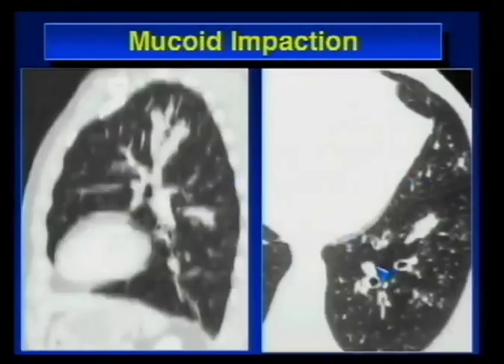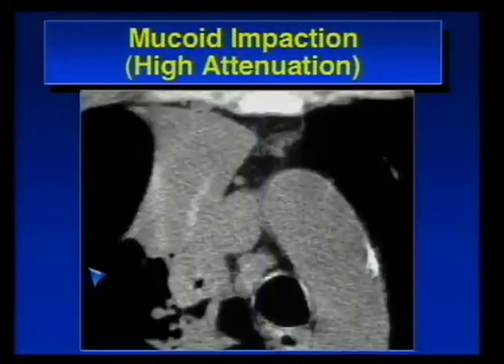And this is another patient. Look at the plugged bronchi here. This is mucoid impaction. And you can see here, this is the finger in glove sign on this reconstructed CT scan. Unfortunately, this person only has 2 fingers on the hand, but there is the finger in glove sign. So it's branching out of plugged bronchi.